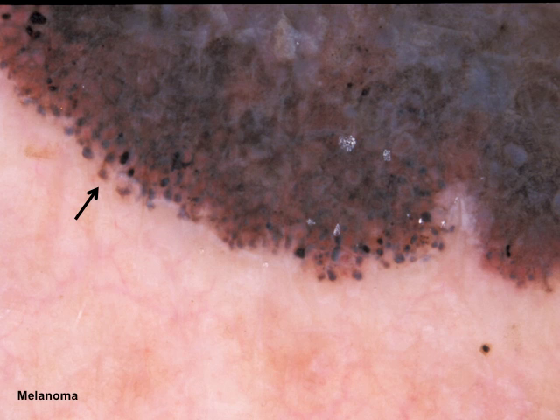Here is an example of a melanoma displaying pseudopods. The arrow points to a linear extension or streak that is emanating from the tumor. This linear extension consists of a stalk with a bulbous ending. Notice that the bulbous ending has a width that is more than twice the width of the linear stalk from which it originates. This is the characteristic morphology of a pseudopod.